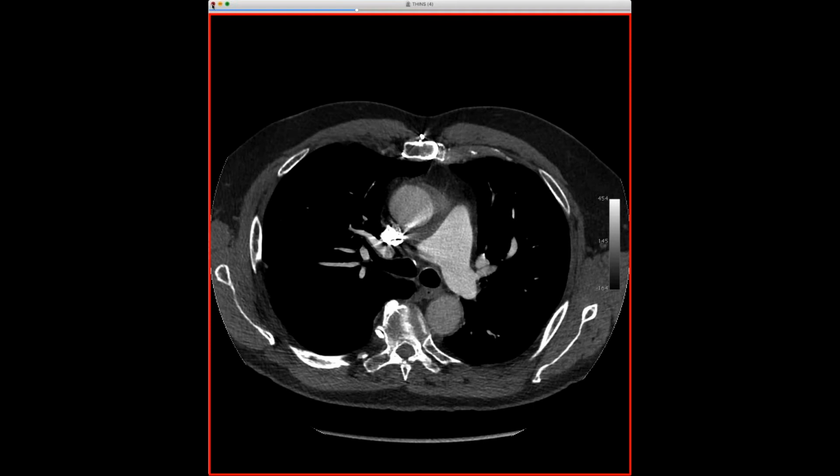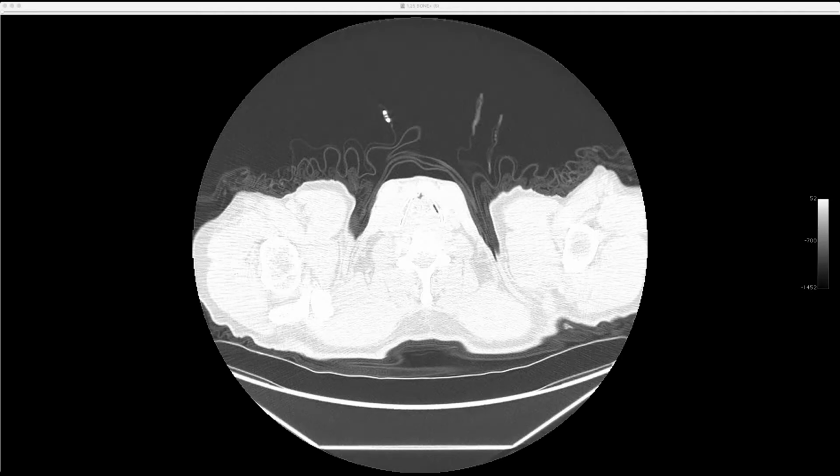But it seems to communicate with this fluid right in here. So that's what we're thinking. But we decided we would do an MR just to prove that it's not leaking somewhere, and to also characterize this stuff around the medial and posterior aorta graft. I don't know what it is, but it was bizarre. Seth said he'd seen it about 3 times, and they never had proof of whatever it was, but that was his thought. Brent, have you seen something like this?